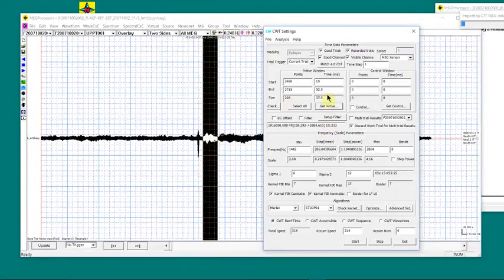Connect. So we got the time from 15 to 52. And this is a control. I don't need a control. I can get a very nice time frequency data.